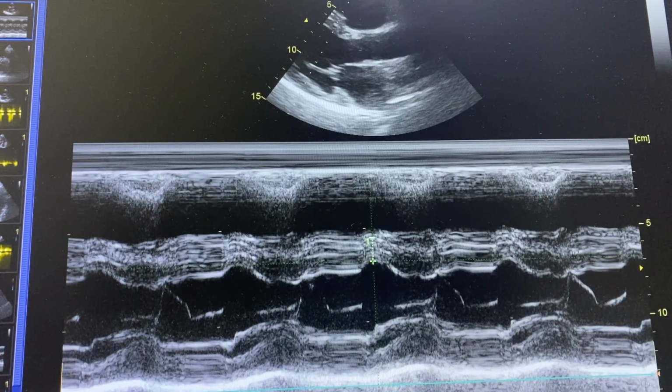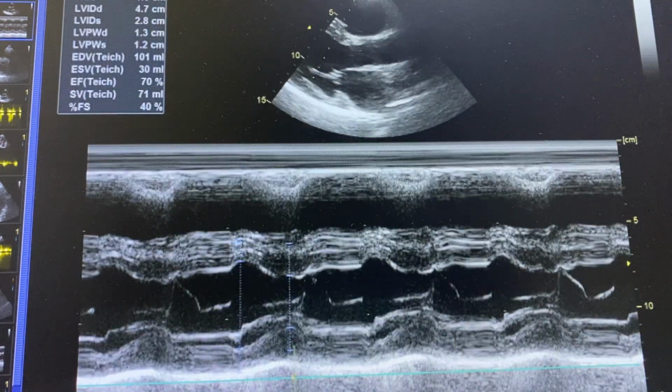If you take everything, it will be massive. So it's 1.3. Proper identification of the boundaries is very, very key.